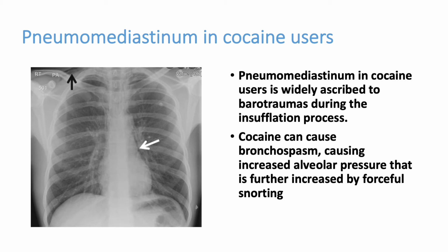Cocaine can also cause bronchospasm. It can increase the alveolar pressure, which is further increased by forceful snorting. So that's a complication which is commonly seen in cocaine abusers. This patient may not require much treatment for the pneumomediastinum. That takes time to heal, so we have to wait.